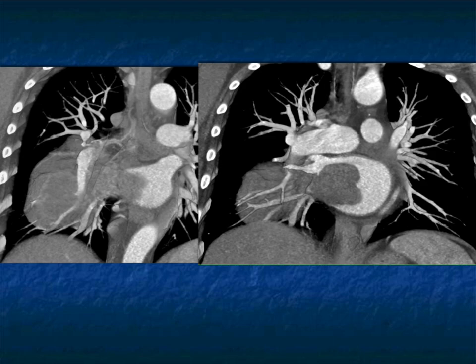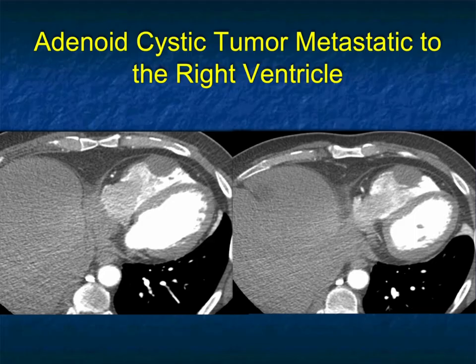So when we have tumors that involve the lung, direct extension is not uncommon. Most commonly, it's going to be lung cancer, primary lung cancer, but things like melanoma can do it as well. Another case. Here you can see a lobular mass sitting on the patient's right ventricle. That's not a thrombus because it's pushing in.